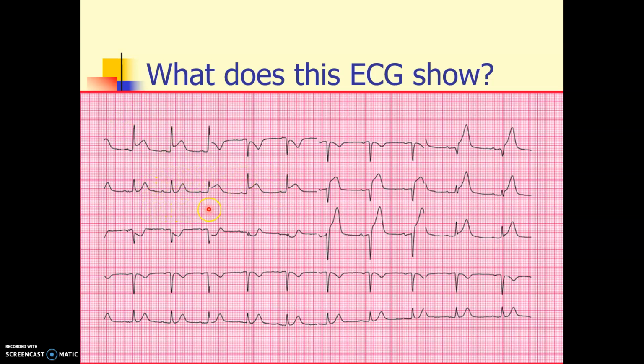And then if we go to the lateral leads on the precordial side, they clearly show ST elevation as well, but this extends to V3, V4, and even up to V2. So this is anterior, but this is lateral. So this represents an anterolateral infarct. For each of these, I also want you to try to figure out which vessels are involved and at what level.